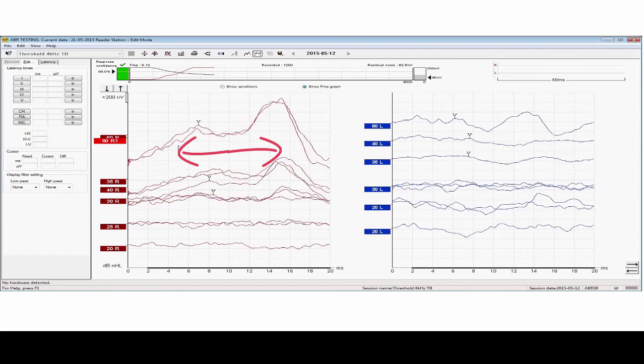But at the very high level, we see peak 5 in this measurement is around 7 milliseconds, and the PAM is still clearly within the FMP range. So yes, it does boost the FMP very much, but we do not mind because it is proof of hearing. It is a true response. It just doesn't make the curve more beautiful.